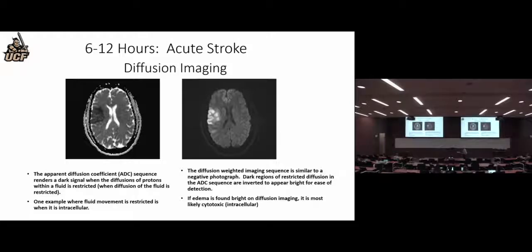But then if you go to the diffusion-weighted image with its corresponding ADC image, at the same stage, you see this really coming out. So you might even ask, well, why don't we do diffusion imaging for all strokes rather than CT scans? There are some places that are set up so well with scanners that go as fast as possible that do that quite a bit. But for most hospital work, CT is much cheaper and much faster. And again, a lot of these patients are confused, they can't hold still, and you wouldn't get a nice looking scan like that.